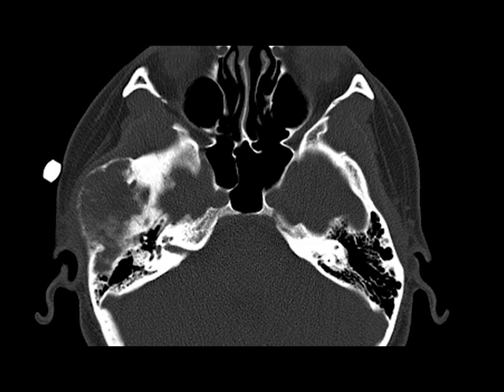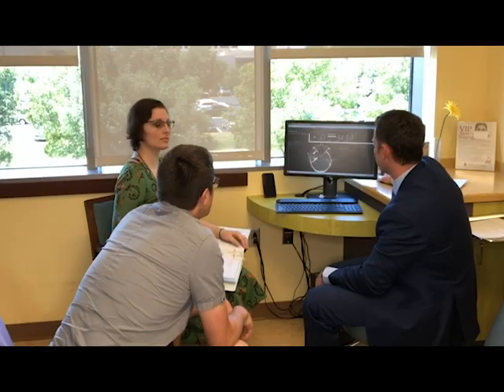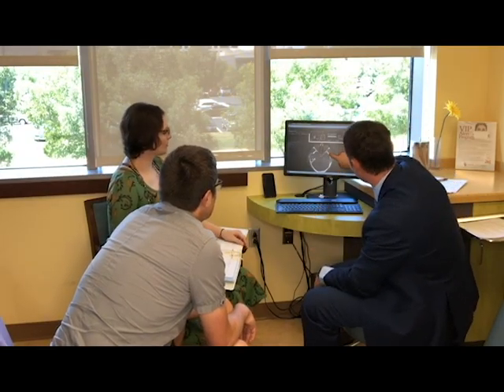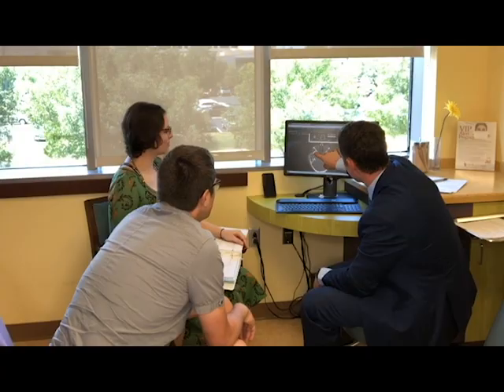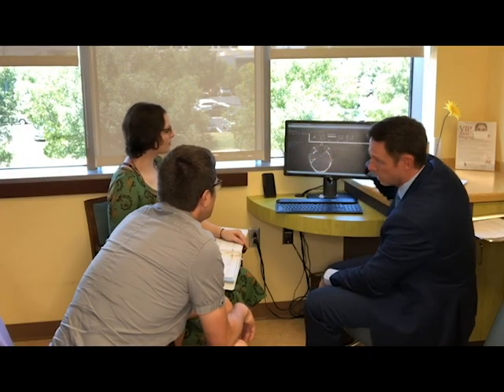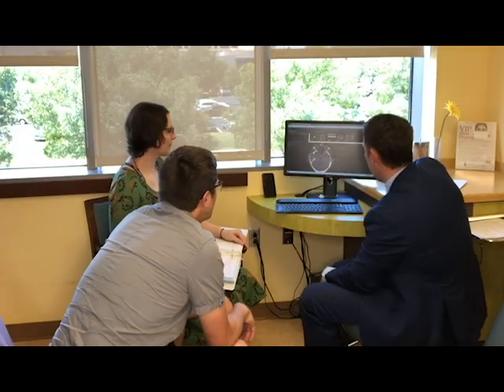And so this is the temporal bone, and we'll talk a lot about that in a minute on the affected side. And so just as a first pass, it should be roughly symmetric, and you can see normal skull here, and that's what we would call an expansile mass of the right lower temporal bone, which is right here.